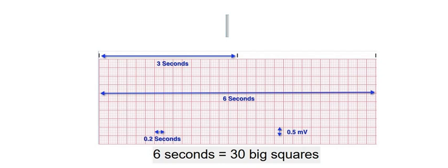It will help you to calculate your heart rate. If you did UWorld, like I said before, they will say to you, click on the exhibit. When you click on the exhibit, they will not give you the heart rate. They're just going to give you a strip, and it's up to you to calculate the heart rate. It's up to you to figure out, is this a sinus tach? Is it an SVT? How are you going to know if you're not able to calculate the heart rate? So we just look at this EKG grid and we'll figure it out.